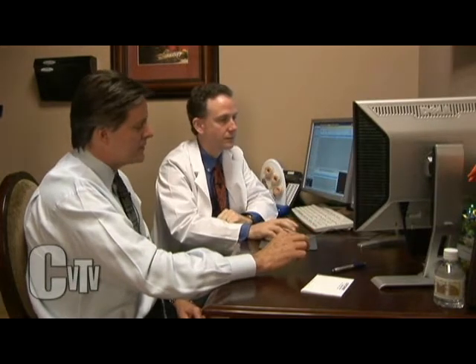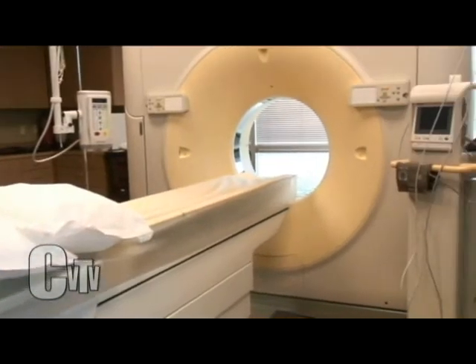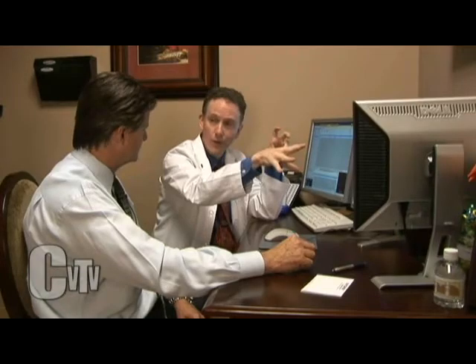You know, before we jump into that, perhaps it'd be good to talk about the process of getting the test for one moment. I've had 2 of them, so I've got a little experience. And for what you're about to show us, it really isn't uncomfortable at all to get this information. It's done with a very fancy, sophisticated kind of CAT scanner. It's just a big donut. It's not like an MRI where you're going in a big dark tube. Takes about 10 minutes on the table generally, and to actually take the pictures is about 10 seconds.